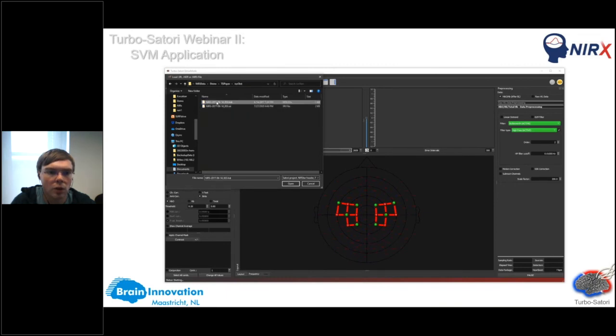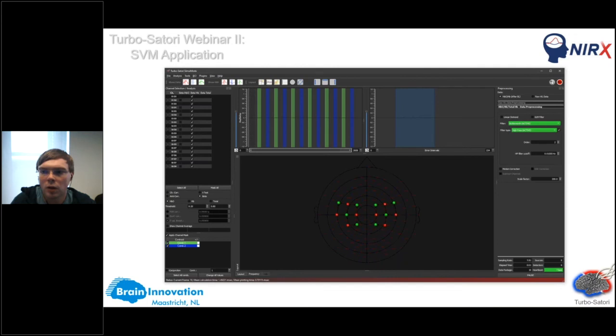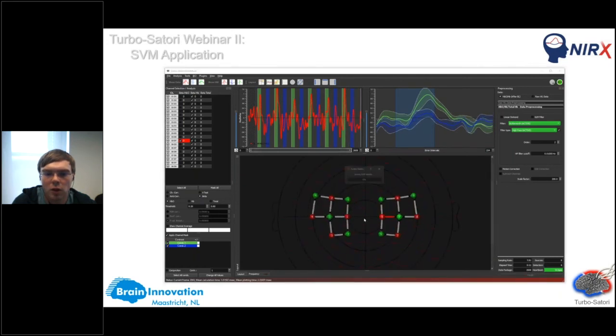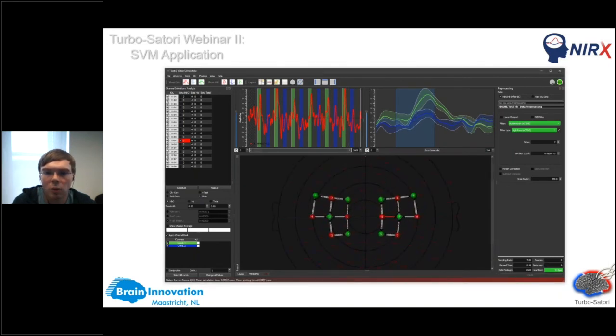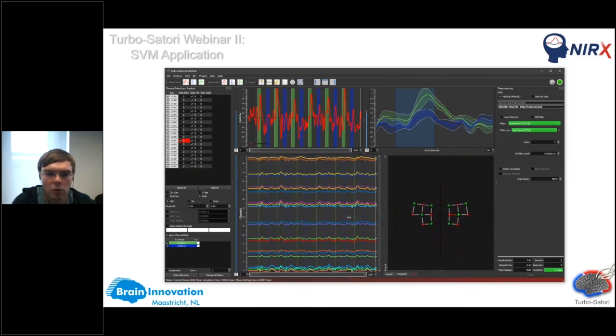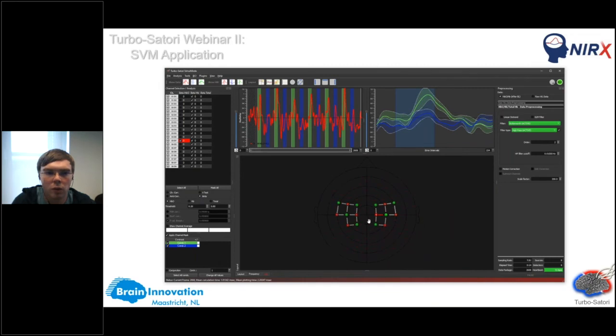So just run the same data here, and using this wheel, running it fast. The requirements to run these applications are pretty low, but it depends on the amount of channels that you want to use. In this case, 20 channels will be no problem at all. If you have bigger designs, 128 channels or more, you have to take care that there's enough processing power, enough CPUs available. But you can, of course, hide specific parts like this plot. You can hide it completely, which will decrease the load for the software.